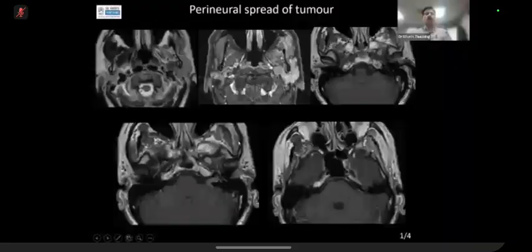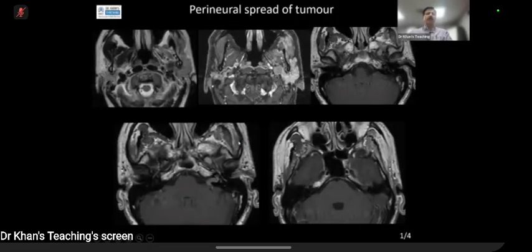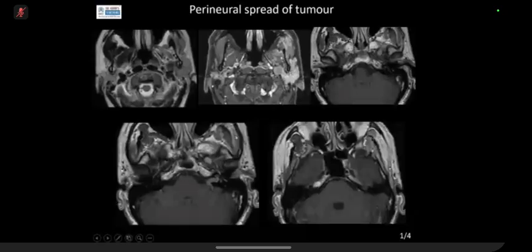This patient came to our hospital with two years of facial nerve paralysis on the left side. And the imaging which was done was CT temporal bone, and many a time MR was done by the neurologist. But the key point which everybody forgot is that adequate imaging was not done of the parotid, because parotid lesions can also cause facial nerve paralysis.